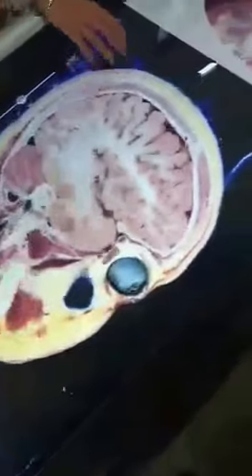And what's interesting is these are actually the scans that were done from the cadaver. So everything you see here is what we saw at 0.6 to 0.8 millimeter thickness. And so each time I turn around, slide through these sections, I can see where it lies on the actual scan. And you're not just limited to the head and neck, you also have areas like the brain, larger areas like the thorax and the abdomen, all the way down to the leg and foot.